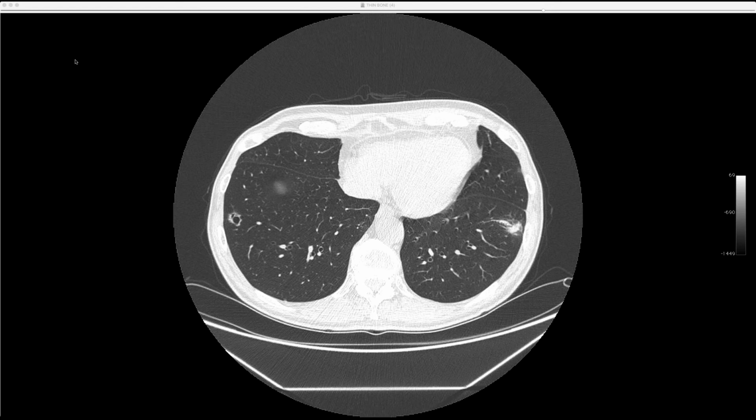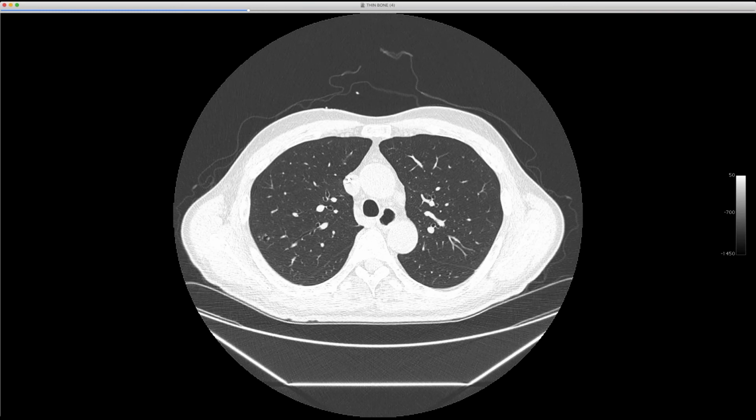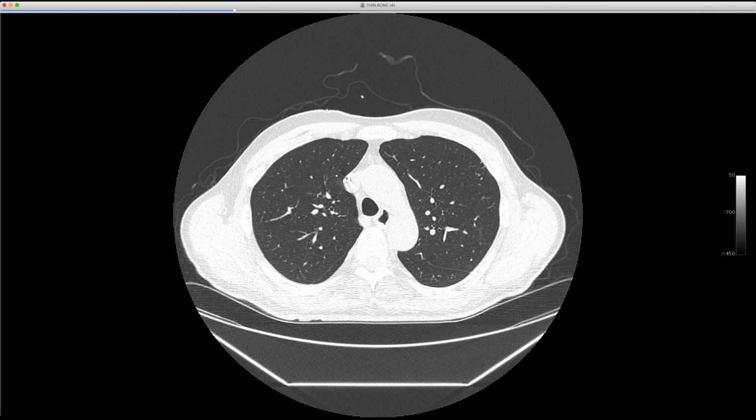Okay. Well, yeah, I don't know, Jeff. I've got some Cheerio cases that are urothelial cancer, and I don't know if I missed the window too, or if they just started out like that. Yeah, I mean, because the first we saw them was on this February CT, very thin walled. I mean, they really look like cysts. I have seen them solid turn cystic.